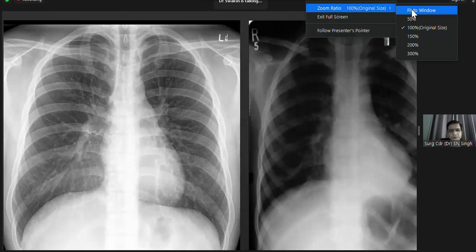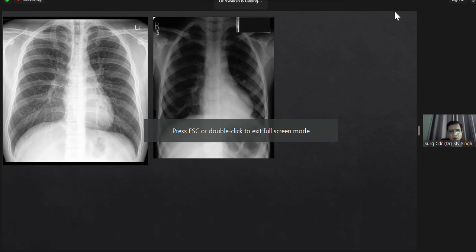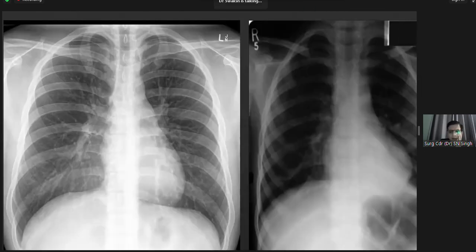So this is the frontal chest radiograph. So the scapulae, clavicles, and the ribs are normal. Lung field appears normal. The cardiac silhouette is normal. However, there is a triangular shaped retrocardiac opacity in the left paravertebral region.